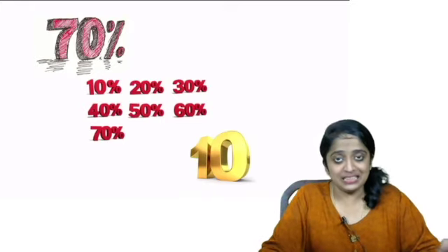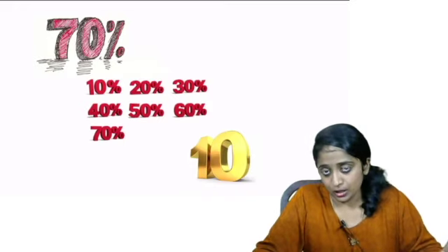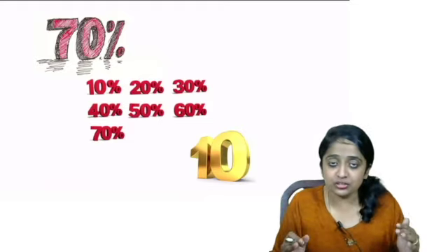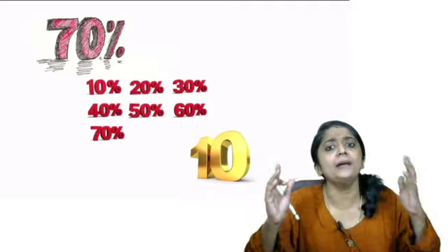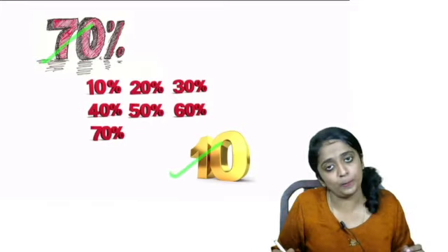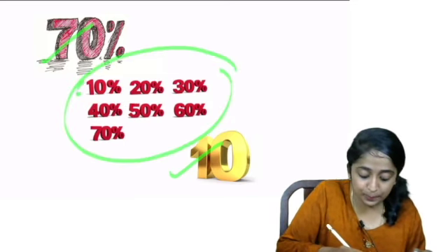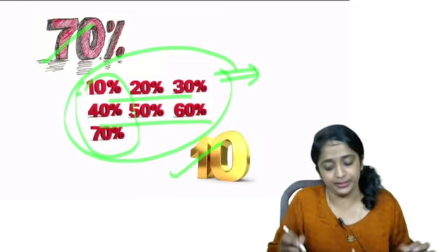So let's discuss CT features of COVID-19. Like in X-ray, all we're going to see are infiltrates. So we're going to check for patterns and classify those features seen in more than 70% of cases of COVID-19. We may call it the more typical or highly probable findings category. Those seen in less than 10% of COVID patients are very atypical, so very unlikely, and those in between 10 to 70% of COVID positive patients come under the indeterminate category.